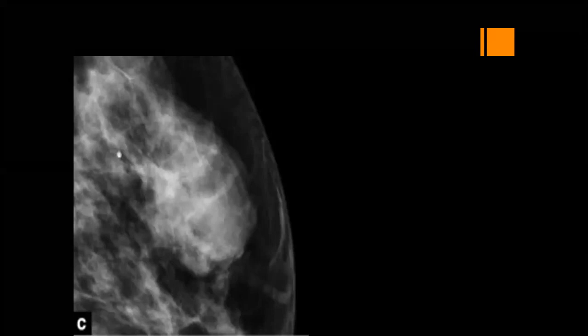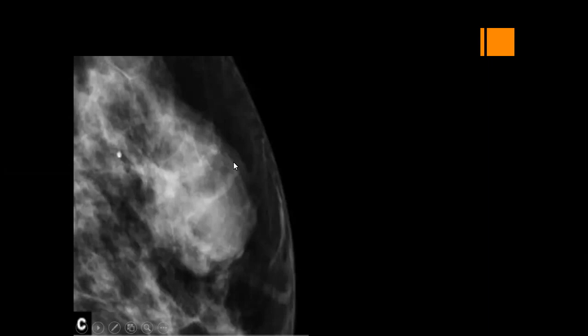So, a hint. I don't see it as a mass. This is the problem. Maybe I see the area just. What about this convexity? It is bulging. This is a contour, but the contour below it is retracted inward.